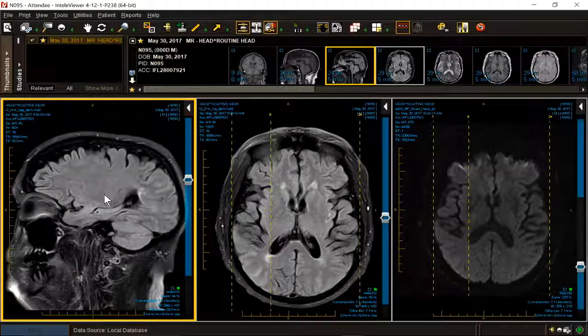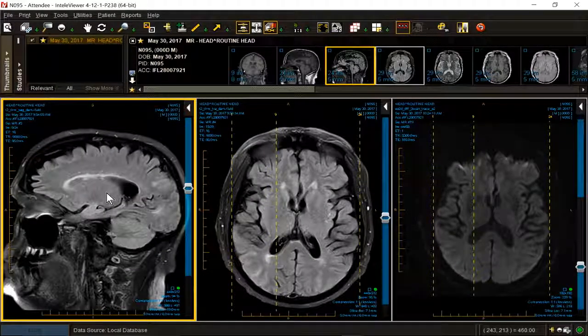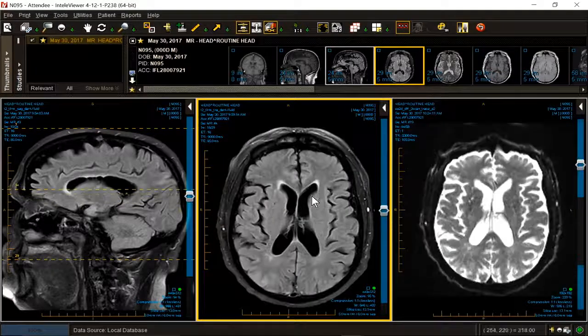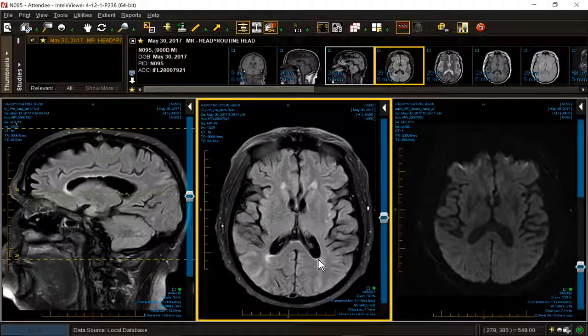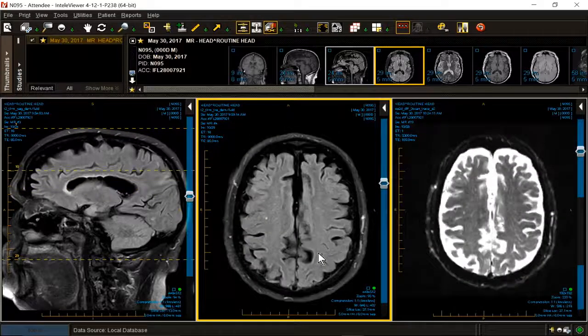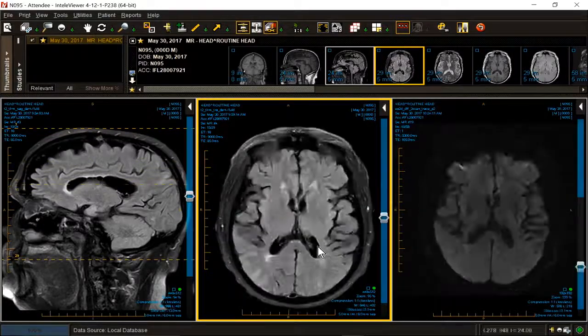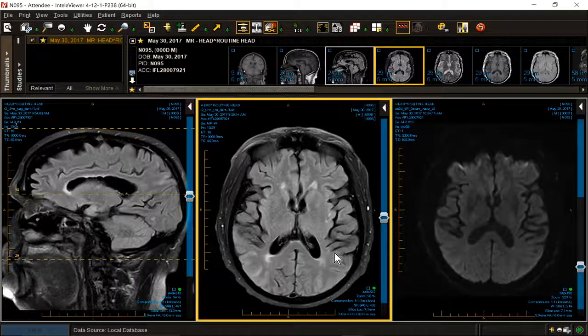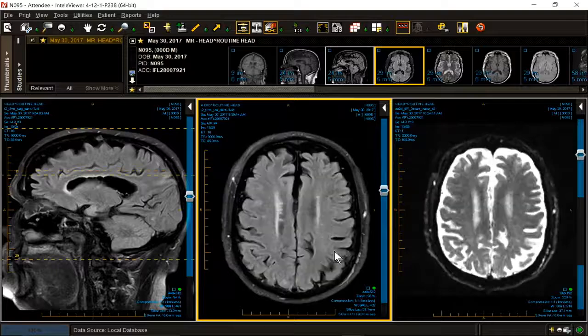So there are certainly some small vessel periventricular lesions. They are not at right angles. They seem rather polar in the front of the brain and in the back of the brain. That is not a typical distribution for multiple sclerosis. They are scattered. They do not have a temporal predilection. There are some abnormalities in the parieto-occipital distribution, but they are not periventricular. They're more peripheral. So if you're thinking about MS, perhaps not.